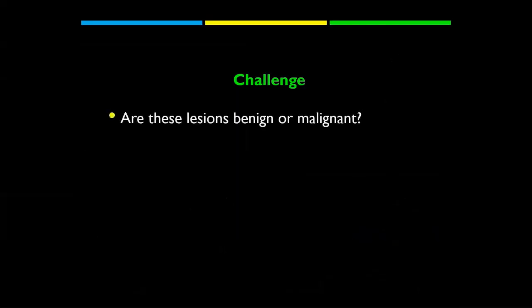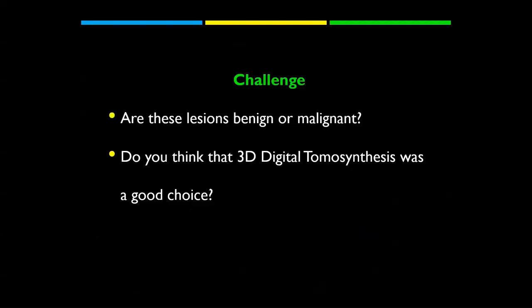Now the challenge in this case, are these lesions benign or malignant? Do you think that 3D digital tomosynthesis was a good choice? And was MRI a good choice or not?